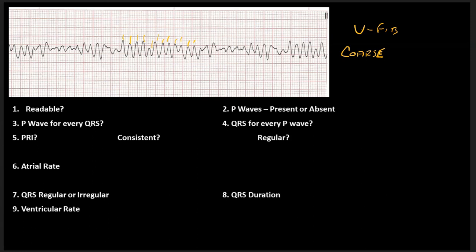But for right now, the patient is not alive. They are in V fib. They have no pulse, and they need to be defibrillated and have CPR performed. So why would you argue, particularly when you're looking at something for a shockable rhythm? It's either shock it yes or shock it no. And the only rhythms that we shock are V fib and pulseless V tach. So that kind of gives you that hint. This would be something that we would shock and therefore continue to do CPR.